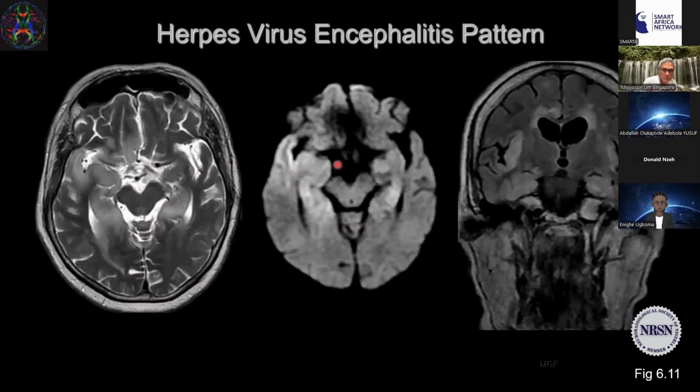In some patients with herpes simplex, high signal intensity can be seen on DWI as well, but it's not constant, and if it's present, it gives us stronger suspicion, and we should be able to distinguish it from ischemic infarction quite clearly. So FLAIR is still a very strong mainstay.